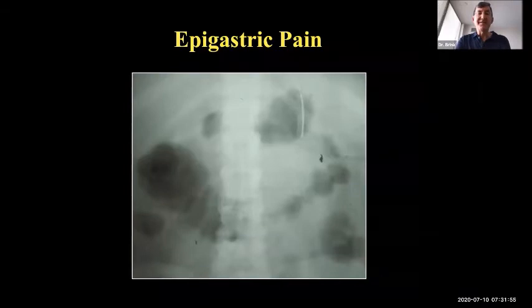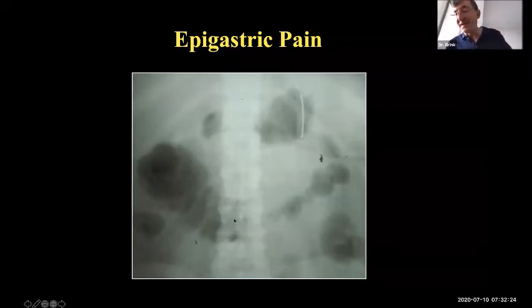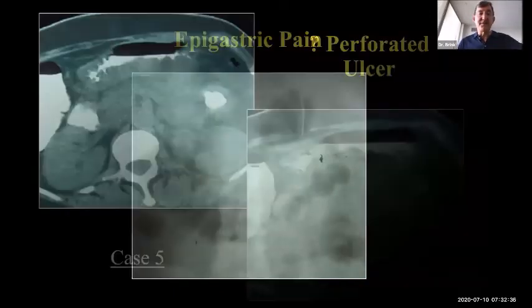It might help you even in a plain film like this. This is a patient, I'm grinning because it's probably more than one could ever get from a plain film, but suffice it to say that if you knew the history was an adenocarcinoma of the gastric antrum, you might say, well, gee, I see an apple core lesion of the gastric antrum, increased separation between colon and stomach with proximal dilatation and distal collapse of the transverse colon. This is potentially spread of disease from the stomach to the colon via the gastrocolic ligament. That would be quite a home run from a plain film like this, but in fact, that's what the CT showed. The CT is such poor quality, I decided not to show it, but suffice it to say that was in fact what was happening.